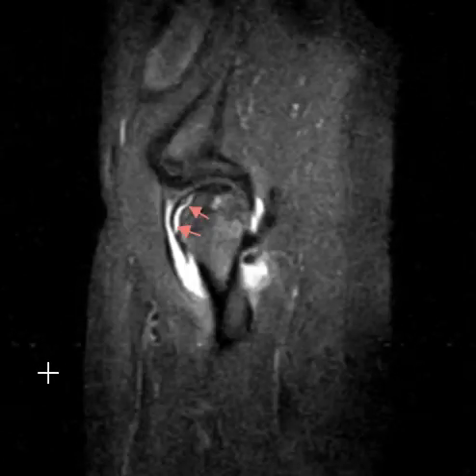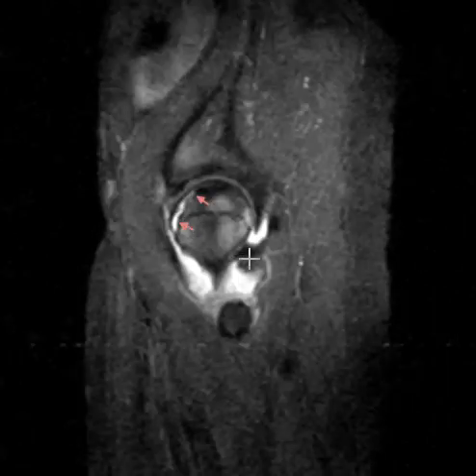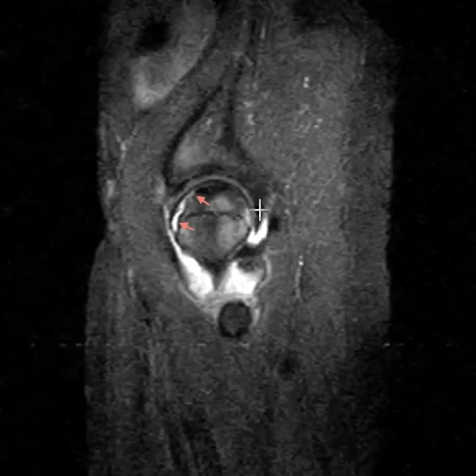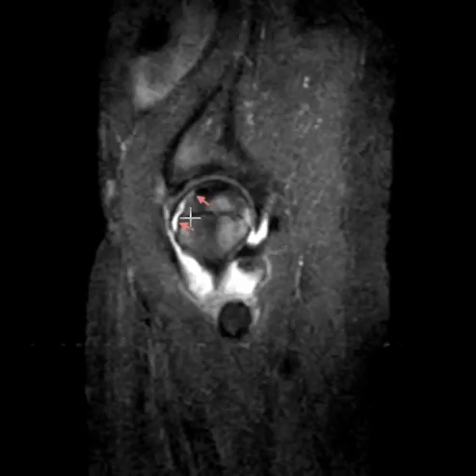So this patient has a very serious injury of, looks like, avascular necrosis, and now this fluid is dissecting beneath the articular surface, uplifting the cortex and periosteum here. And so they need to get with their orthopedic surgeon quickly for some treatment advice. Luckily, they did not have any slip of the growth plate here, so there's no slipped capital femoral epiphysis, which is one thing to think about in these patients if they have AVN or something looks funny up here.